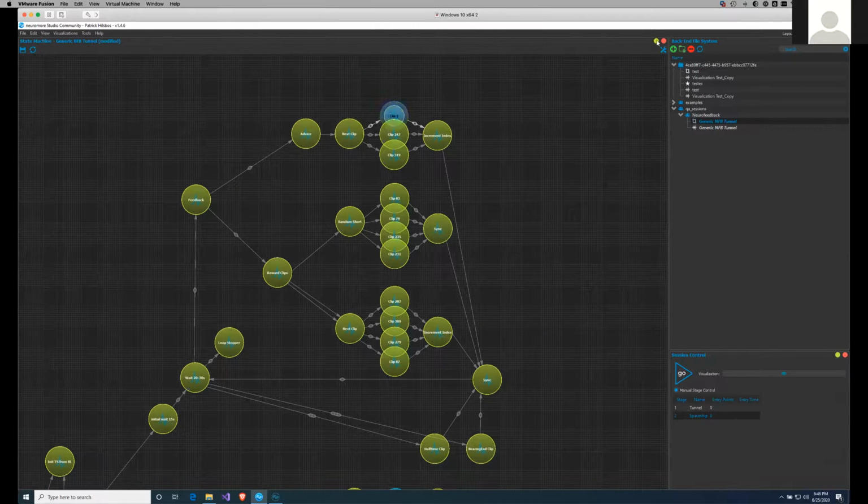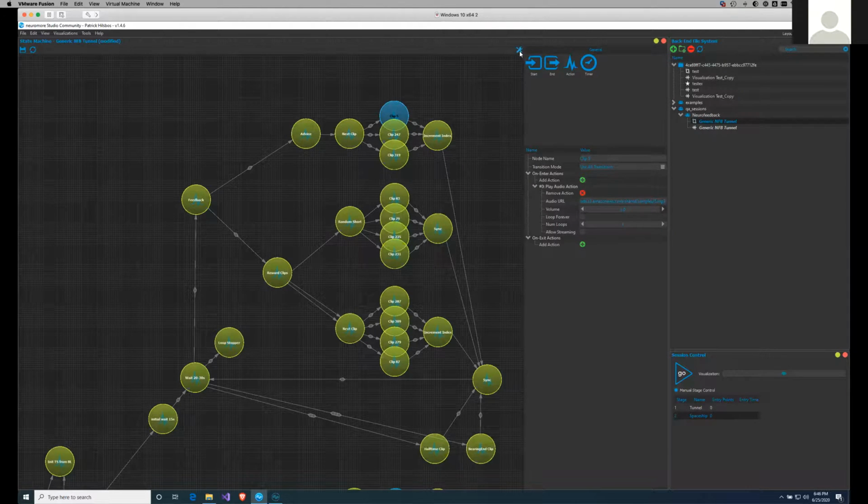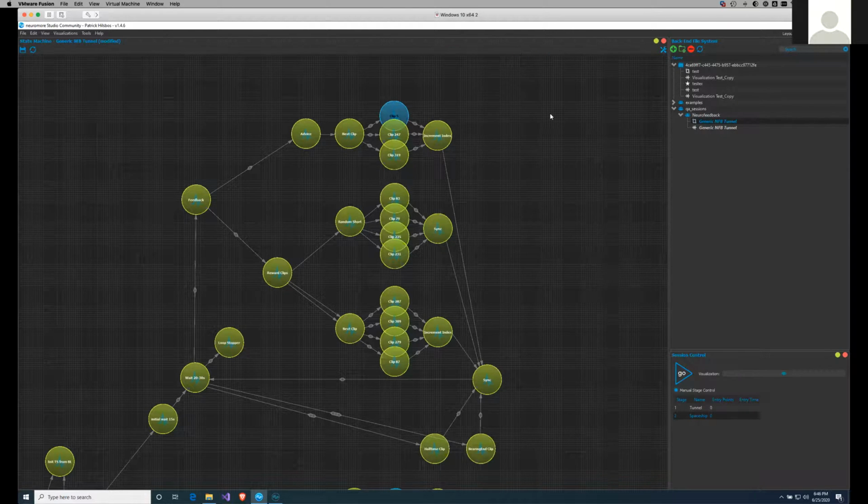Same story here: all those clips are nothing more than MP3 files that sit on the neuromore cloud. You can do your own recordings, just upload them somewhere accessible, change the URL in those particular action states, and then you have your custom reward clips and your custom advice. We have also seen a lot of people use just that particular section to add a whole psychological aspect to the experience. That's something very interesting, and I personally believe also very unique, because it gives you the ability to go beyond traditional neurofeedback and biofeedback and also add the psychological component to it.